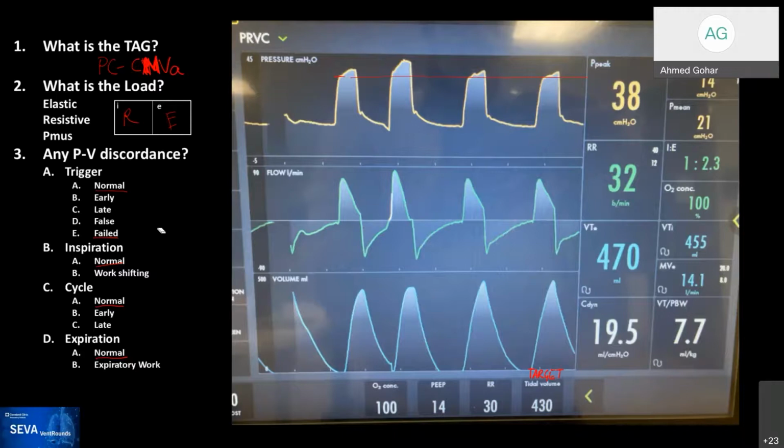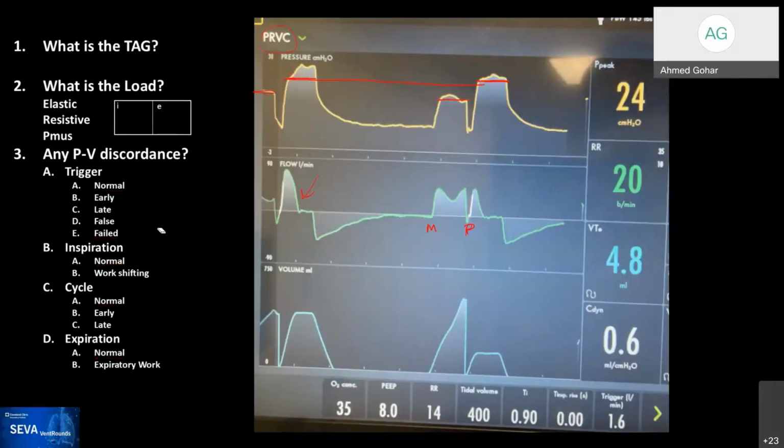Okay. I was just wondering maybe if it's inspiratory, and usually maybe the added breaths like in the next example are too small, so it gives more pressure instantaneously, to try and explain why the algorithm behaves the way it does. You know what? You might be right. I have to think about that. I think it does target the inspiratory volume because it's going to be affected more by leaks in a bad way. Yeah, but you can see that in this one, for example, that's why I brought this one up.